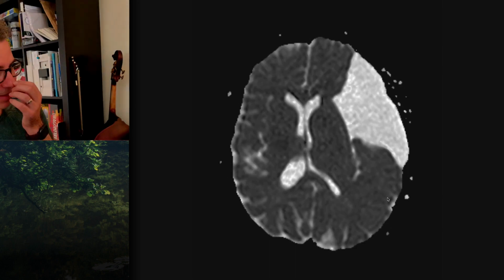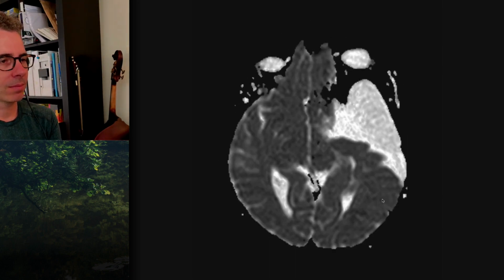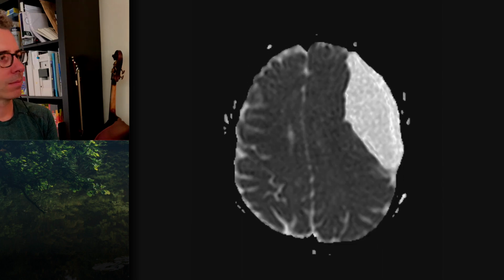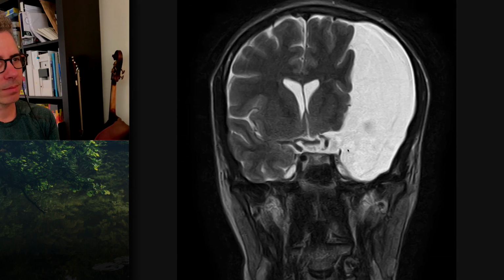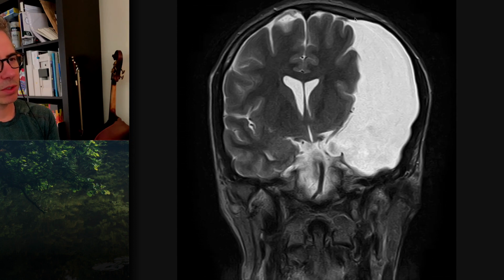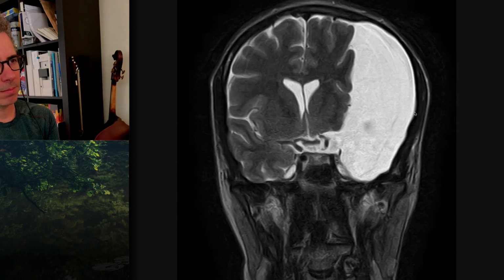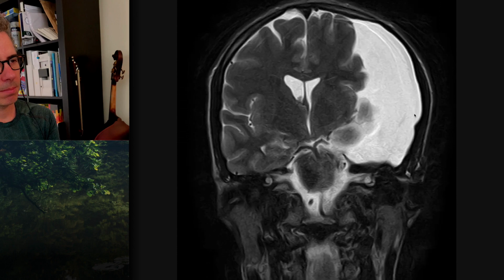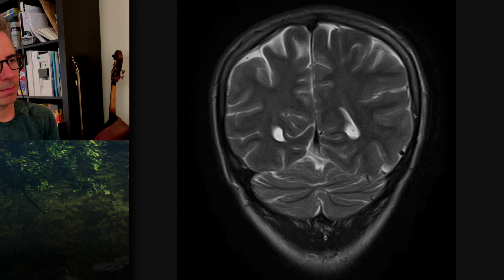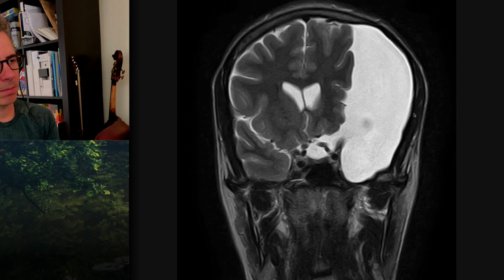Yep, okay. And also, it's hard to completely assess the bones, but the overlying calvarium does appear thinned and the lesion has some scalloped margins. Coronal T2 probably shows that the best, huh? Yeah, I was looking on the axial, but yeah, it's better on the coronal. Yep. So in summary, the findings are in keeping with a large arachnoid cyst.